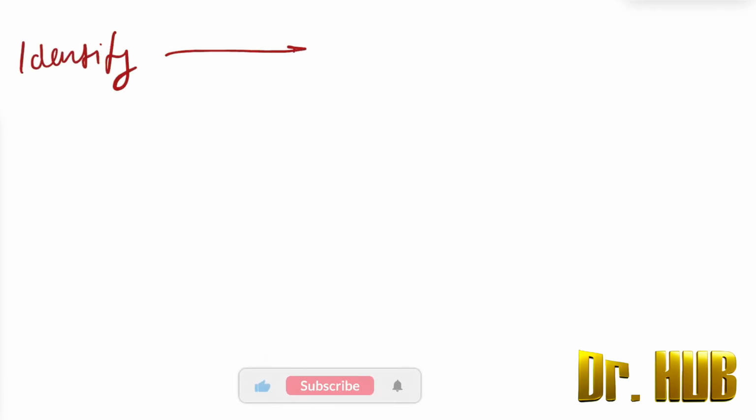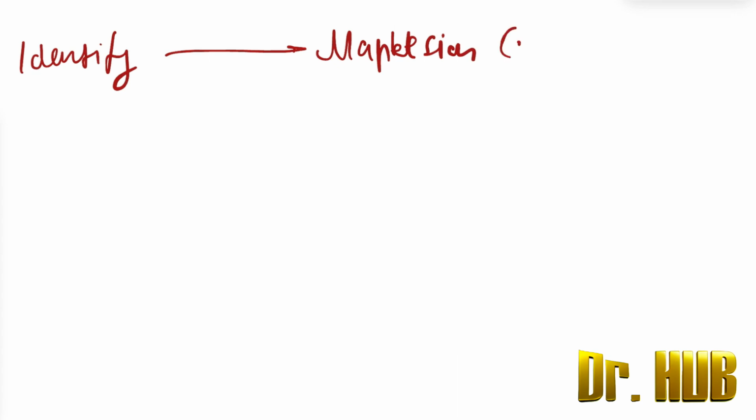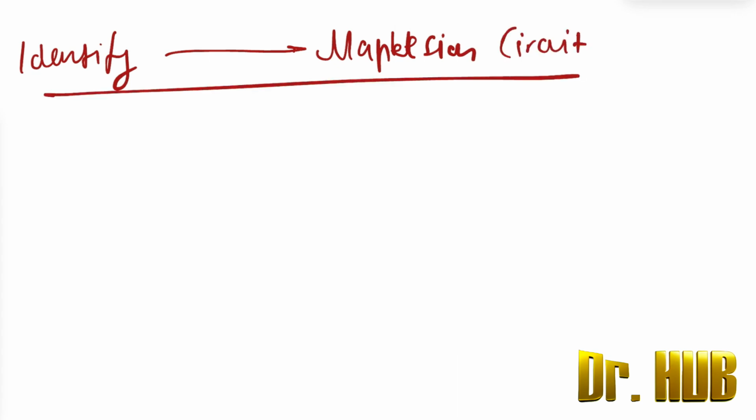Today we look at identifying, so we'll identify what are known as the Mapleson circuits. To begin with, we look at the Mapleson A. Before we move ahead, there are some components we need to focus on.